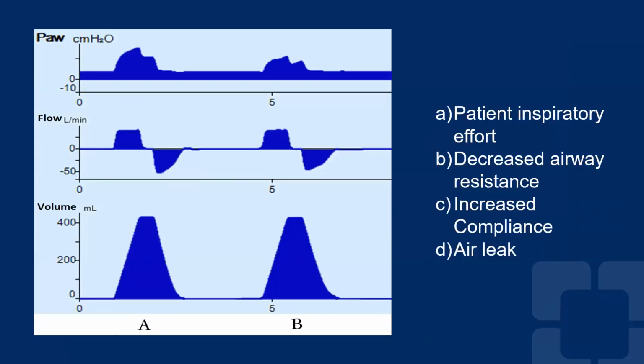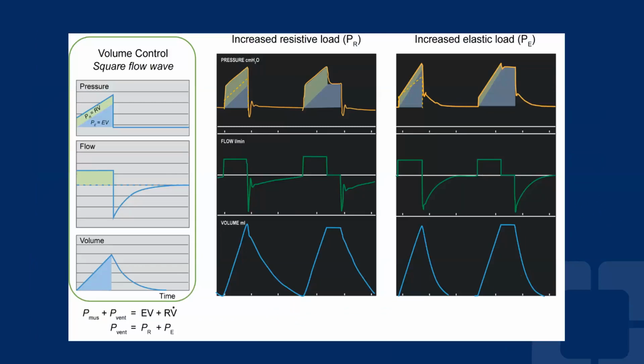Bronchospasm would increase the resistance. COPD exacerbation would increase the resistance. So the only one that you have left is an increase in abdominal pressure, which would decrease the compliance of the chest wall and the diaphragm, and as a result, the lungs. So really nice example of that.